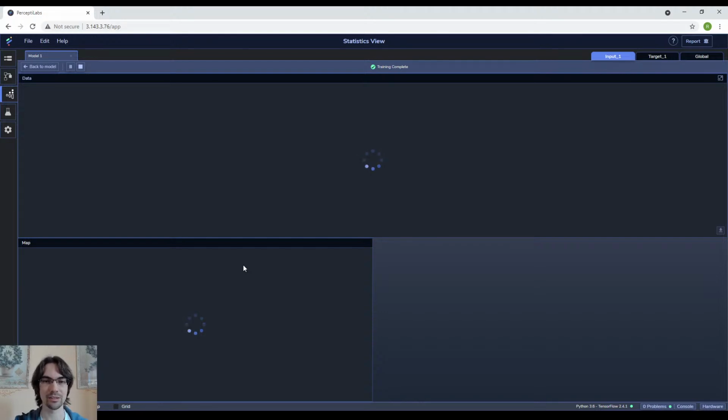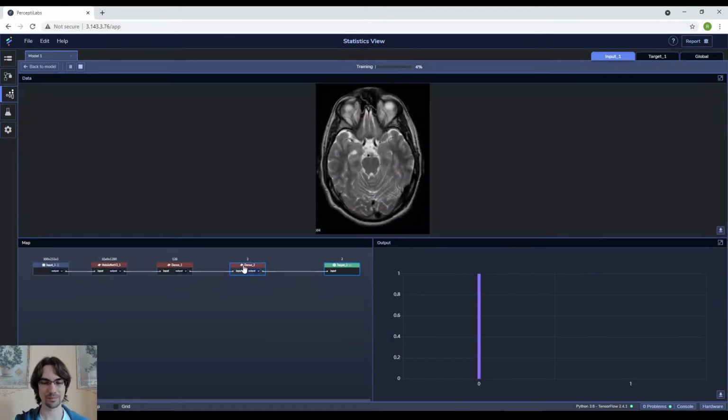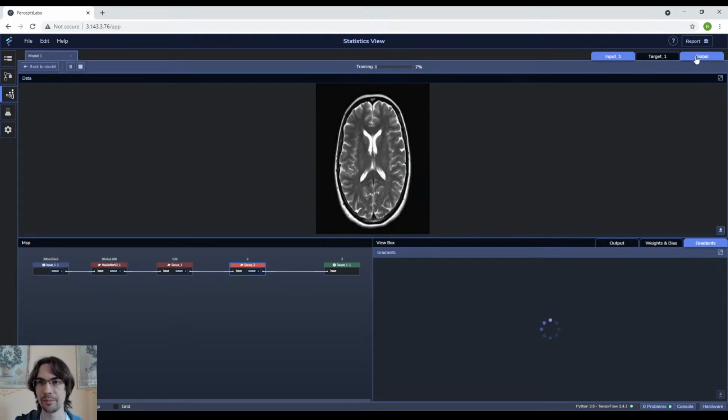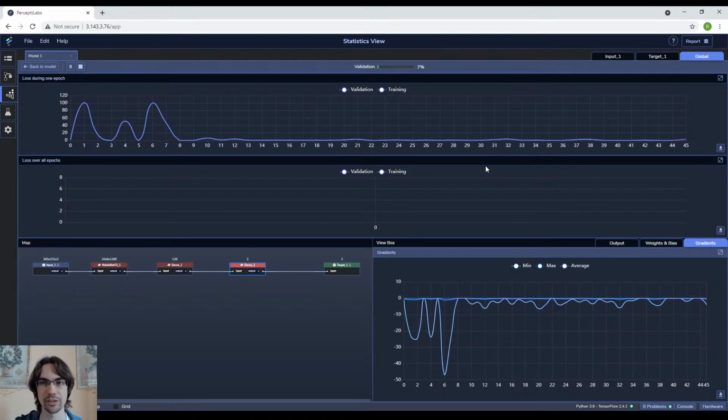After this, we can tag on a dropout as well on the dense layer and see if that improves things. We didn't look at the loss before, we should have looked at the loss, but it didn't seem to overfit at all, which also means we can probably train for a bit longer until it starts overfitting.